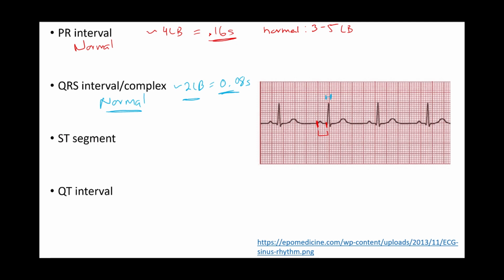You may recall from one of our previous videos, we discussed what happens when we have a widened QRS complex. And we talked a little bit about how this may represent a rhythm of a ventricular origin, because we don't get that synchronized contraction of both ventricles we would otherwise get with an AV node conduction or an SA node conduction. You'll see more of this as we go forward with our modules.